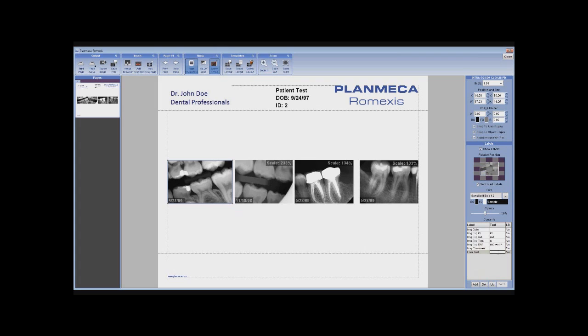Double-click the text box, typing in exposure date, pressing Enter, reselecting this field, clicking on the up until it's above the image date field, and do a line break after the image date. So basically it does a carriage return after it, starts a new line for the rest of the image information.